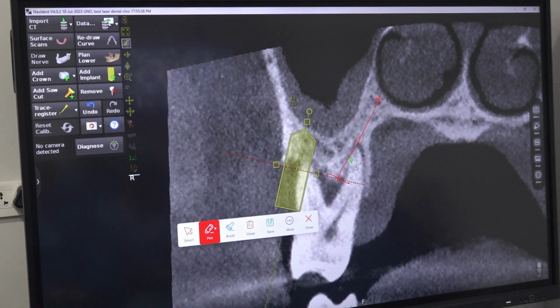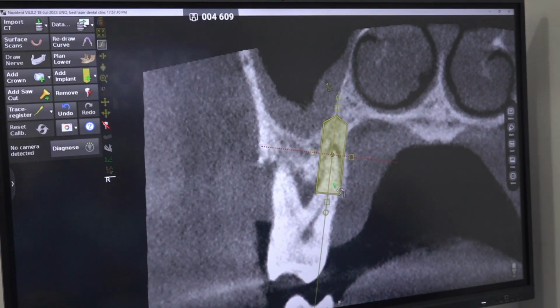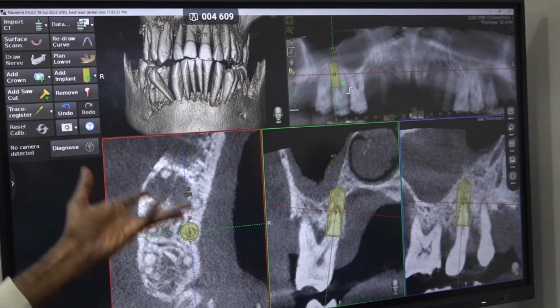But it's worth trying. Or straight away you can place a compressive implant like this. 4.2 to 13 will also work well. It will get good stability, nice. So after seeing 7, I feel there is no need for pterygoid attachment. You can place one implant in 7, and one implant in 6 also.